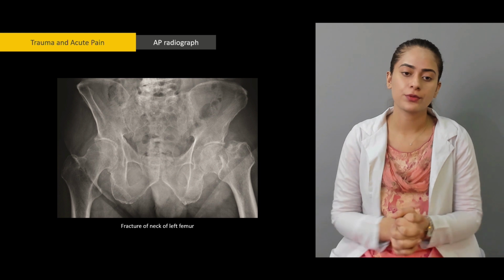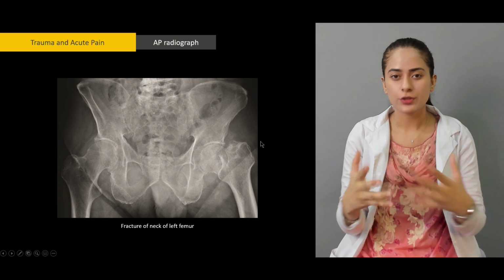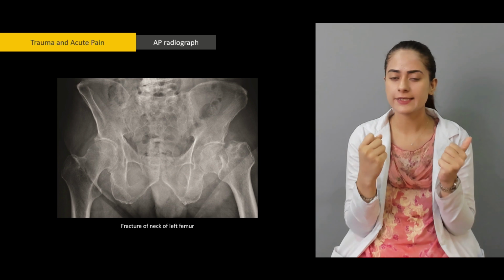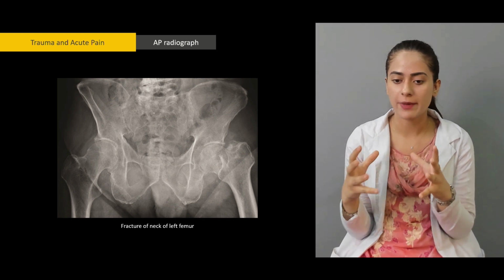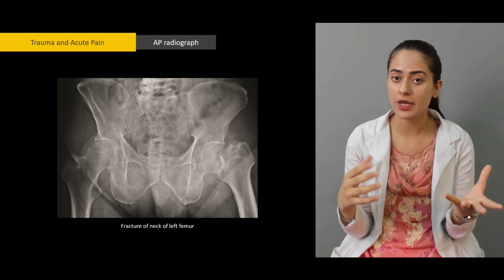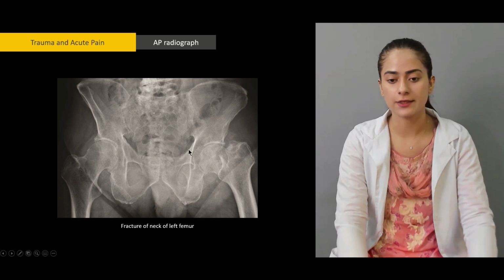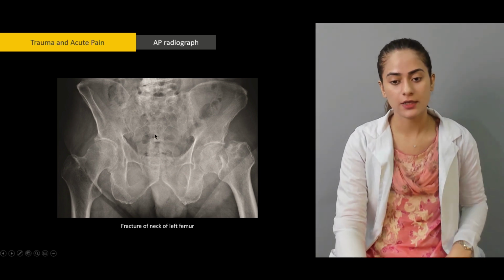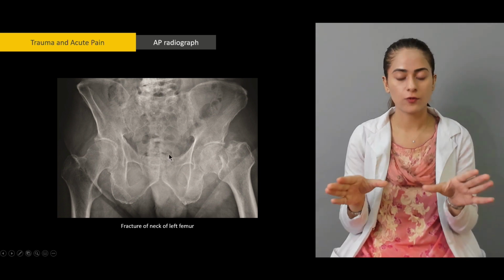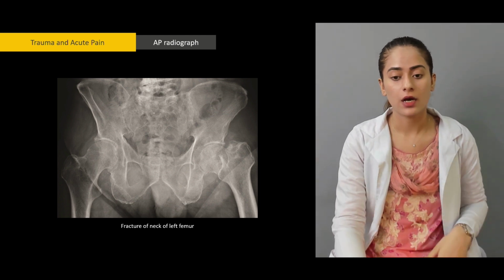So now here we're going to talk about the femur. Before doing that, let's focus a little on something very important. Like I said in the introduction, I'll talk about the differences between a female and a male pelvis. Here I'm going to give you an idea. The ring here is heart-shaped for males, and sort of oval-shaped for females.